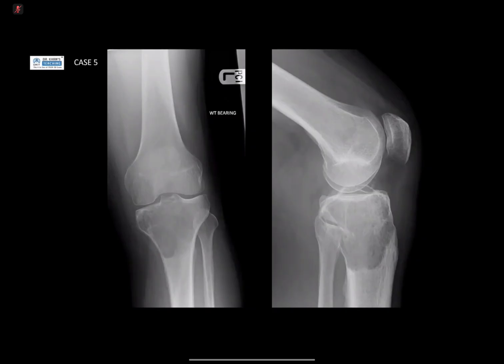The lateral margin of the lesion is not sclerotic. There is no sclerosis surrounding it. However, I see it partially sharp or partially irregular. It's not well defined partially. So this is confusing to me as a narrow zone of transition here in the lower border of the lesion. Okay. And what do you think about the cortex of the medial proximal tibia?